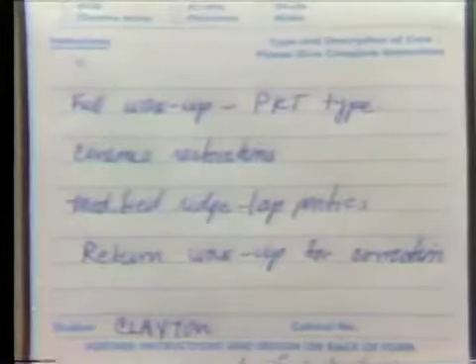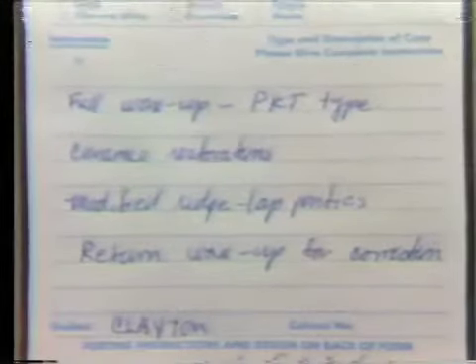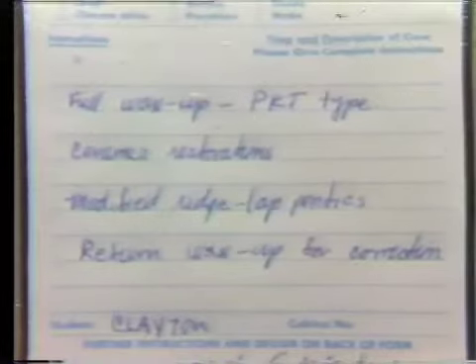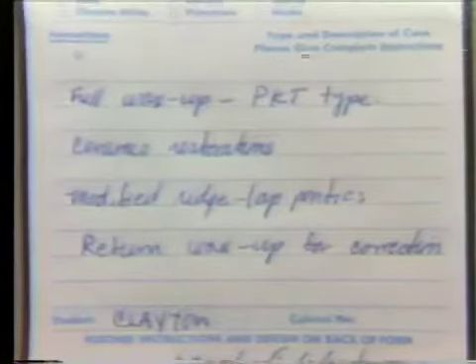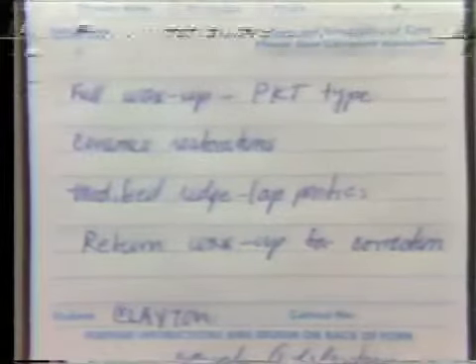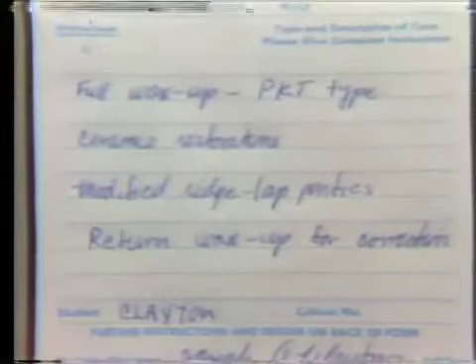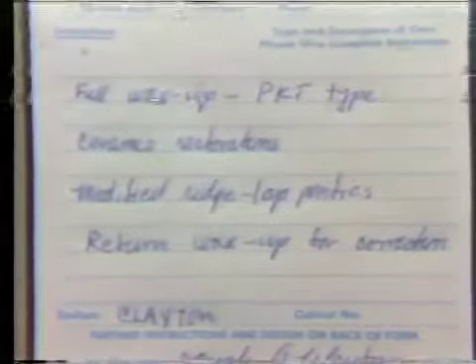We would need such information as the type of wax up that you want, the long centric wax up, or the Peter K. Thomas type as this situation calls for. We want to tell the lab technician somewhat about the material we're going to use. In this case, we're going to use a porcelain fused to gold with facings on it so that he can have some idea of how this will affect his wax up. The pontic design and so on are all important information that we need to send along at this stage for the case to go to the laboratory.